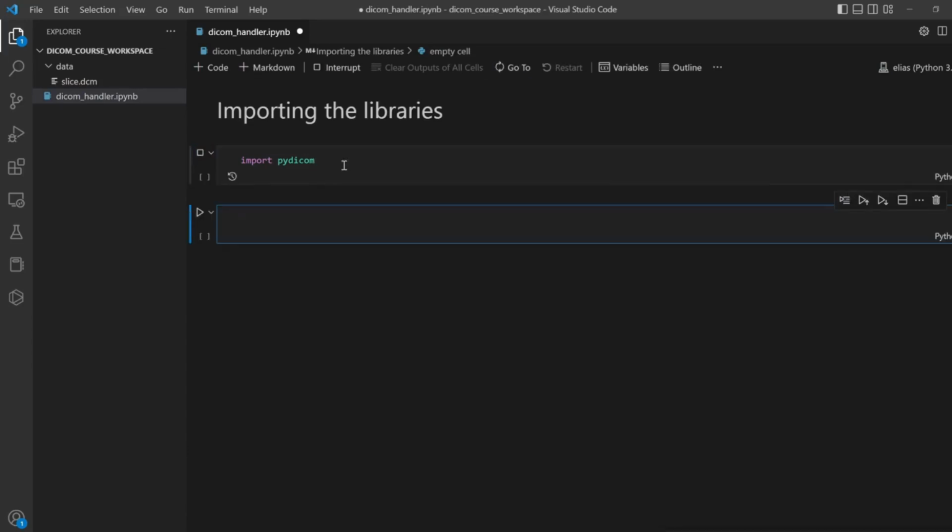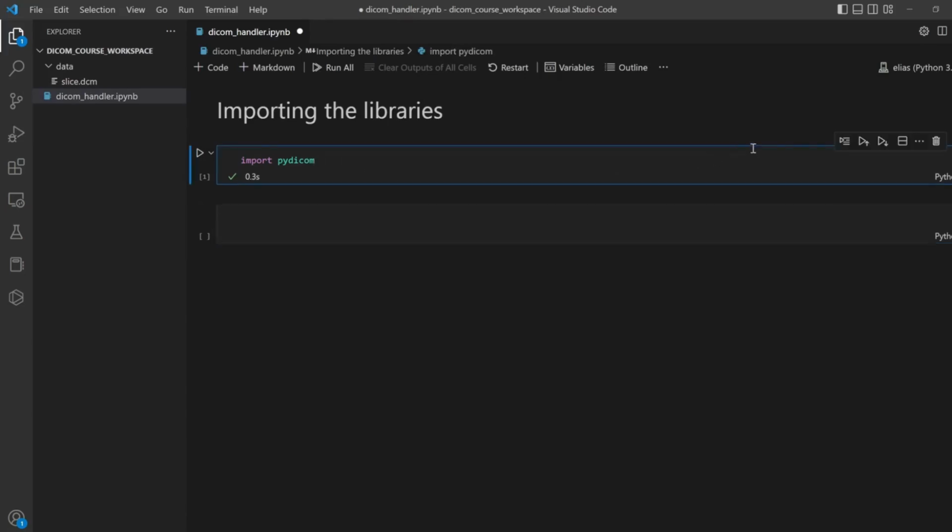Now, if you want to run the cell, once you have completed the coding part in that cell, you can either click here, meaning that you will run this and go to the next cell, which is the cell below. But if you click here, meaning that you will execute or run this cell and go to the cell before. So you can either use this or this, but the best way to do it for me is to click on Shift Enter.